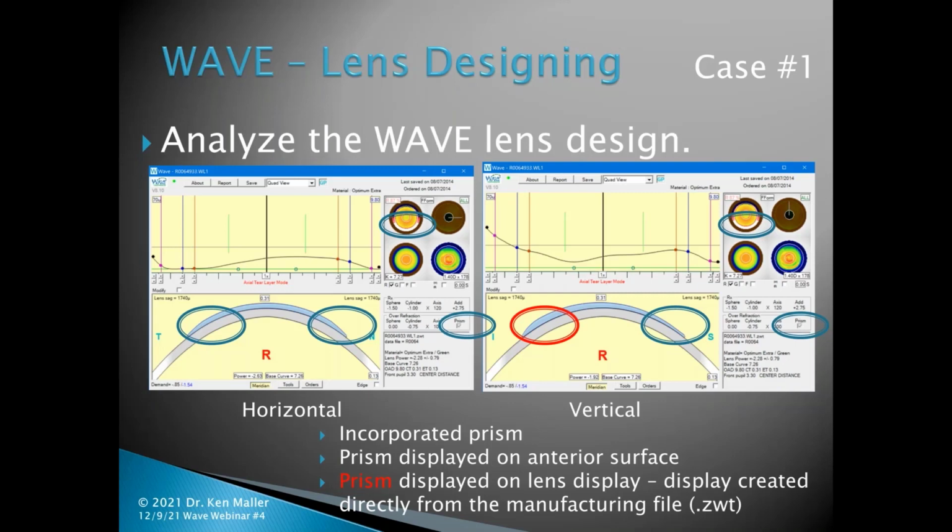And so that actually is an incredibly accurate cross-section of the lens you're designing. And you can see I've circled in red on the inferior portion there. You could see the increased thickness as you approach the edge, especially compared to the superior edge on the upper portion of this particular lens, and how much thicker that is down inferiorly.